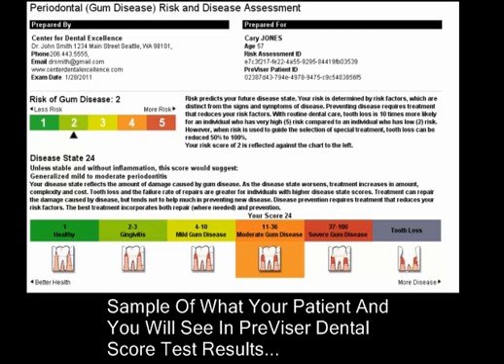In fact, if a patient is referred to an orthodontist, a periodontist, or another specialist who has access to PreViser, entering this long disidentified number into the application when creating the patient record at the specialist's office will recall all prior assessments, but not the name, since that's not present in the PreViser database.